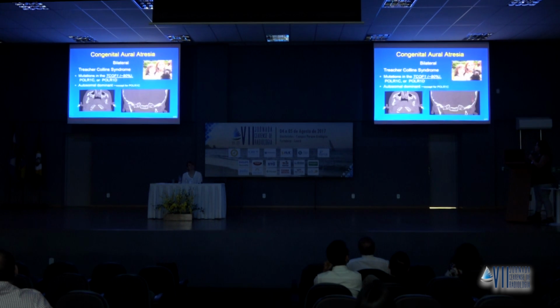Clearly, they have a microsomia, and the site of the abnormal development can have additional temporomandibular joint abnormalities, short ramus, shallow glenoid fossa, and not even formed coronoid process. And you can clearly see the microtia, really abnormal looking pinna on each side.